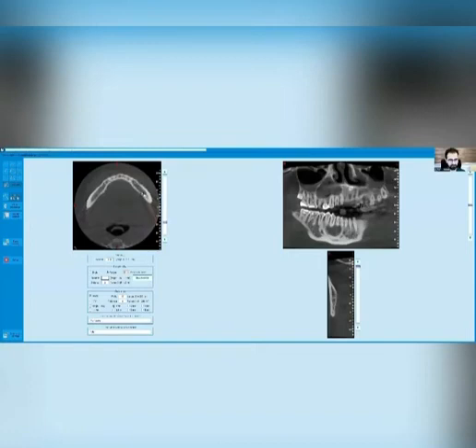Here the nerve goes on. Scroll down a bit more, and you see that the mental foramen is reached here. See the end of the canal. Here it is. We go outside the reach, and here it is. This is just doing one side. We have finished one side of the arch.